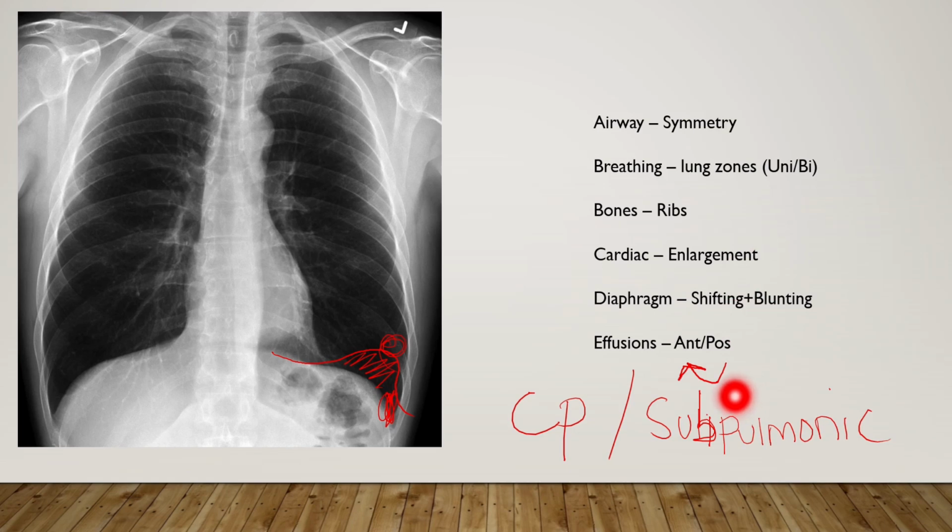All right. So what do I mean by subpulmonic effusion? Well, it's in the word: sub, beneath, pulmonic, lung, under the lung. Where under the lung? This effusion accumulates between the diaphragm and the base of the lung. All right. So basically, the lung is floating on a body of water, which is the effusion, and because of this, you'll see.